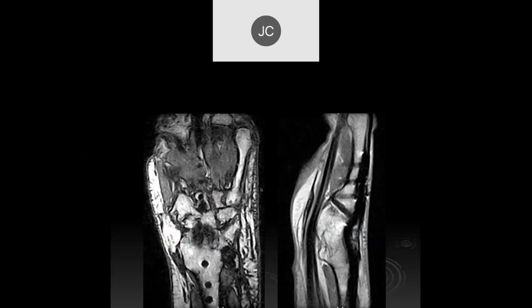Tayson. All right. There are some surgical changes here. Is this a plate and screw fixating the dorsal wrist? Right. So what do you think this is? Looks like ankylosis of that. Yeah. So this is a surgical fusion.